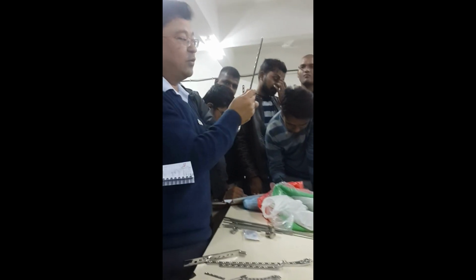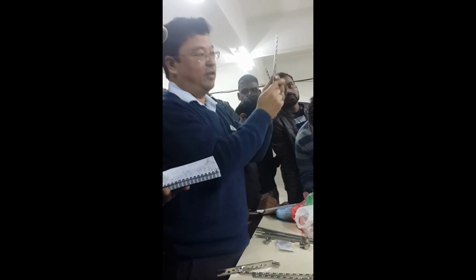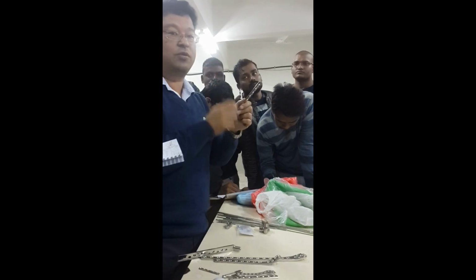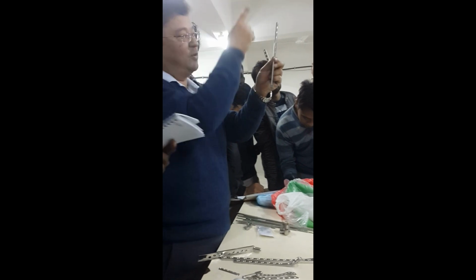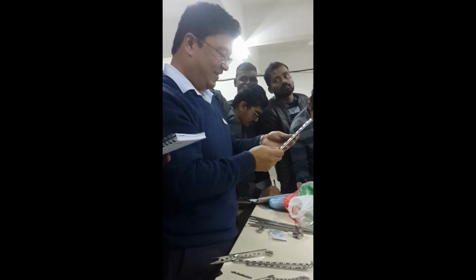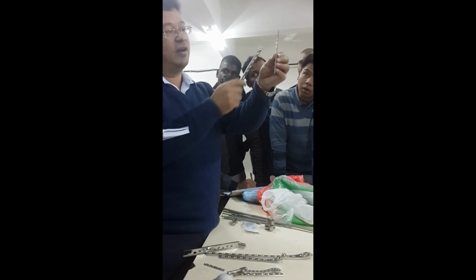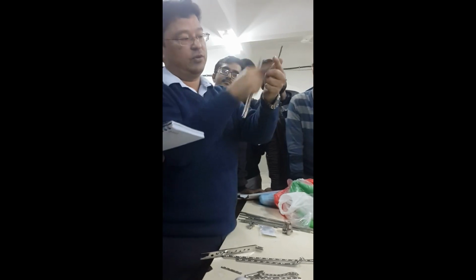And the patient will look at the X-ray. They don't know where you apply the screws, and we don't explain anything like this. They just look at the X-ray. Why not 3.5? It's too small. How will you make a stagger? You use 4.5 here. We don't have that.